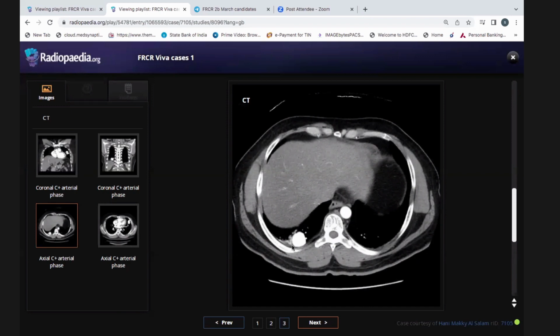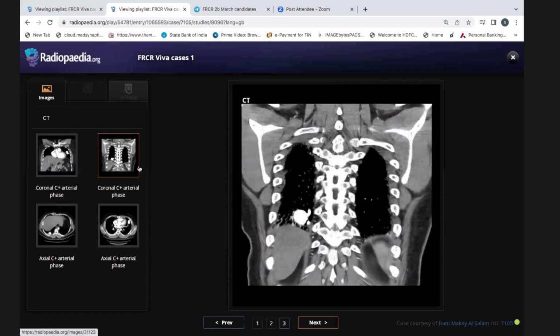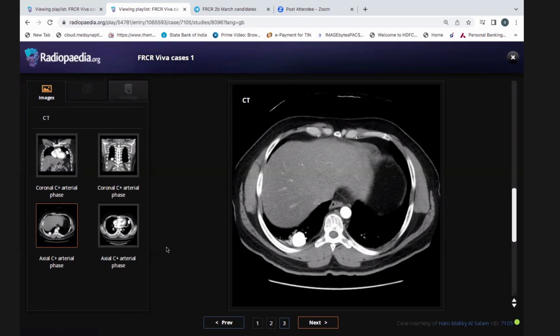The right lung zone also shows vascular structures, associated with a mild atelectatic band in the lower lung. In my routine practice, I'm checking the lung window as well. No associated liver vascular lesion on these selected images. So it is multiple pulmonary arteriovenous malformations.